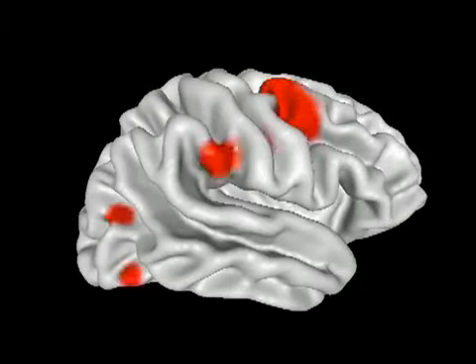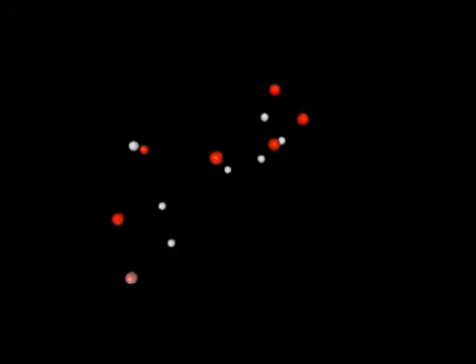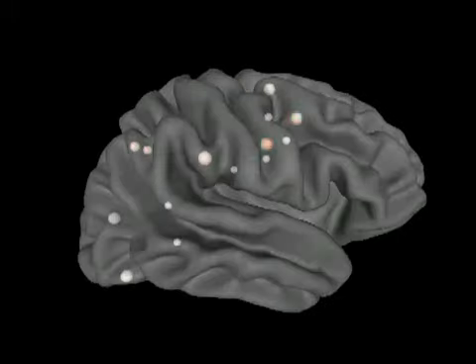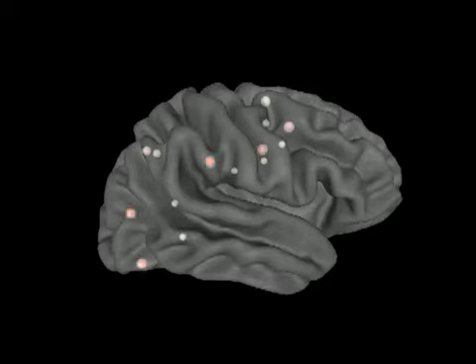We can also look at the nodes, or the Brodmann areas, that constitute nodes of the dorsal attention network and examine them in detail. In this case, it's with a 100% transparency. We can make that less transparent by changing it slightly. And then, of course, we can zoom in and zoom out of the nodes that are deviant from normal of this network involved in attention.